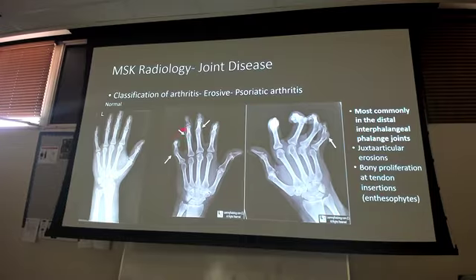Okay? Where's my joint space at? It's eroding away, right? Look, here's my normal. I don't got no joint space. This guy can't even straighten out his hands because his is so bad. And I got no joint space. So there's step one. Okay, I got no joint space, it's in there. All right, I got some erosion starting. It's in the interphalangeal, the DIP joints.